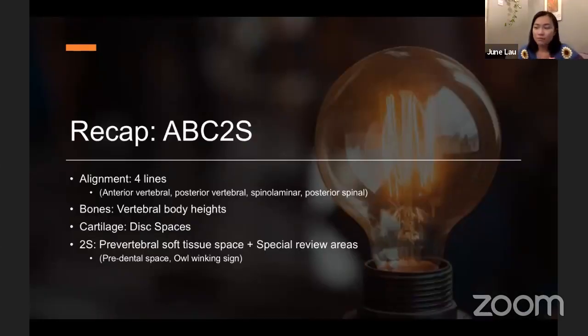There weren't many cases, but if you just remember alignment and soft tissue, those are the two things I think are quite different in a C-spine x-ray. If you can remember those two things, I think you will pick up most C-spine injuries. I think it's wonderful that you all saw the degenerative changes as well, because you'll see that by the truckloads. But hopefully you feel a little bit more confident the next time you're faced with a C-spine x-ray.